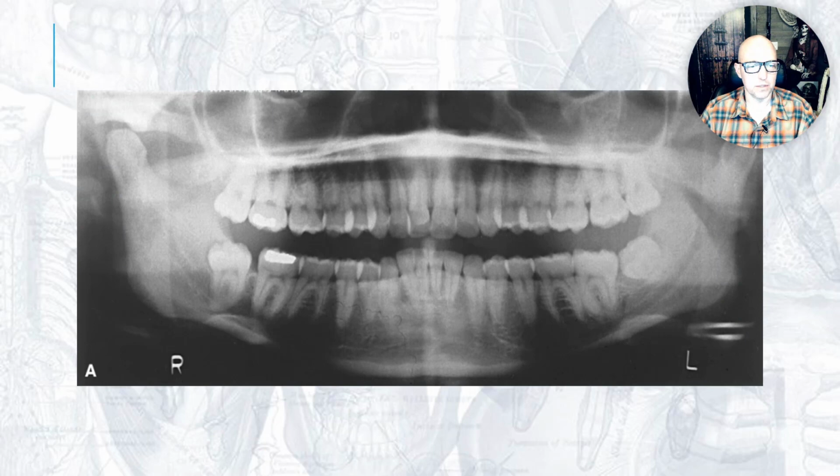What's wrong with this one? This one's a little subtle, but look at the hard palate line, and what was it I said created the error when the hard palate line overlaps the apices of the maxillary teeth? That's from chin up a little bit. Even though the occlusal plane largely looks flat, there's a little bit of a downward curvature right here in the midline, and just a little bit too much. I want to see a little bit of downward inclination of the occlusal plane, so I avoid that error right there.